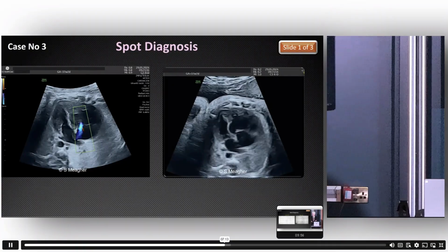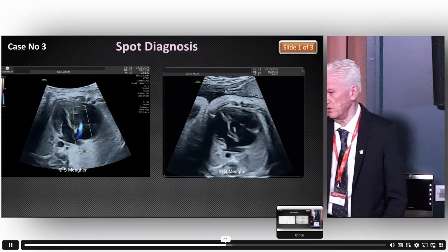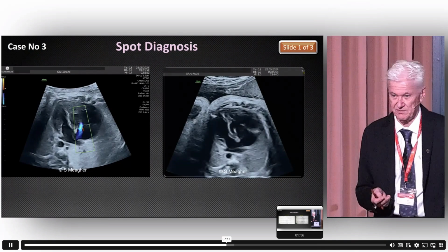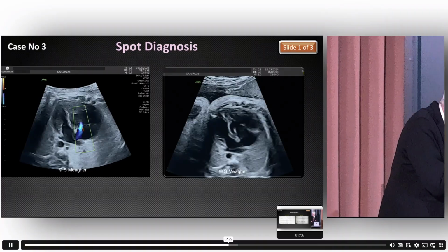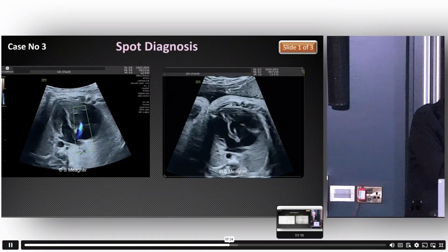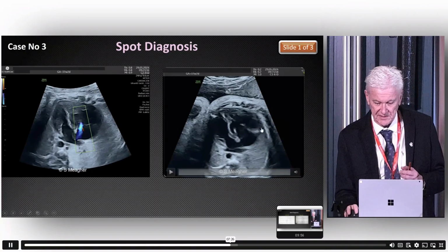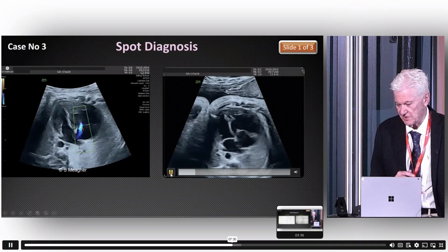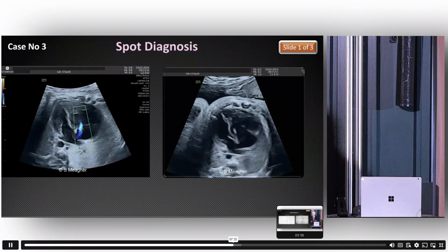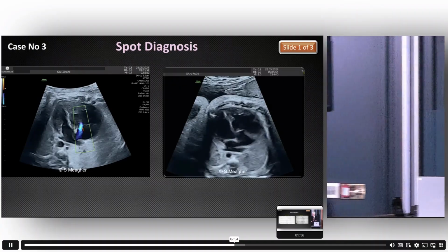I'll start, maybe get the ball rolling. Do you think the cardiothoracic ratio is 50% or less? No. So we agree that the heart is sort of enlarged. The cardiothoracic ratio is probably more around 60-65%. Okay. My next question to you is, is there anything, or maybe you tell me, what's the thing that strikes you on the four-chamber?